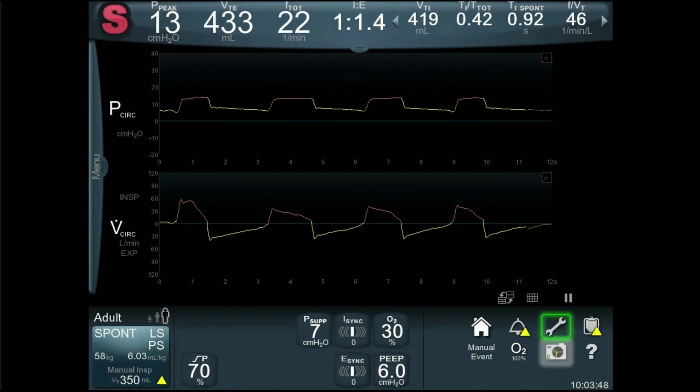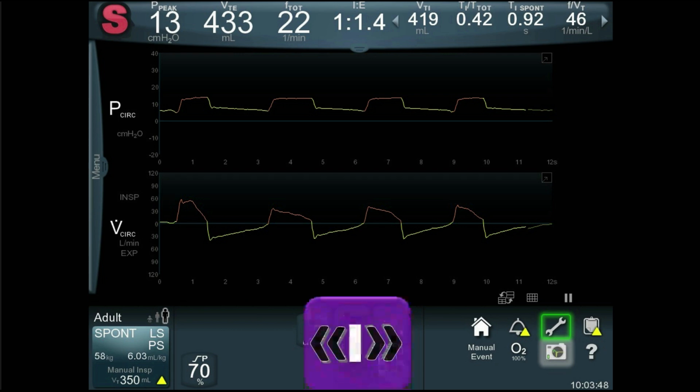What about an alternative approach? I'm putting a cartoon of IE sync here. At this point in time, I'm only going to concern ourselves with E-sync, that's expiratory synchrony. The setup is an eye in the middle of the screen and 2 chevrons on either side. So that's 5 options for how you adjust this. You click the main button on the ventilator to make the adjustments. For the vast majority of patients, if you put them on IE sync, it works out perfectly well and saves you from even having to think about the E-sens.